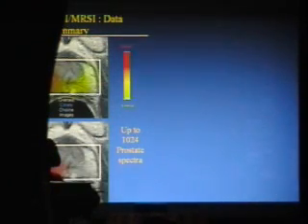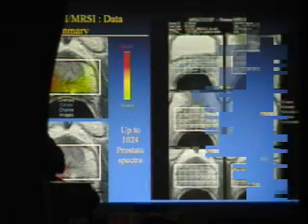Of course, it would be really cool if they all came out of the computer looking like this, where you'd have this nice color-coded picture which tells you that red is hot and red is bad and red is cancer. But we don't read in color. But this is what they do at UCSF, and they demonstrate the cancer very nicely here.